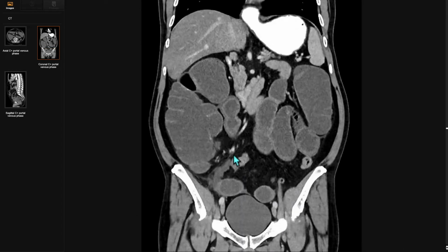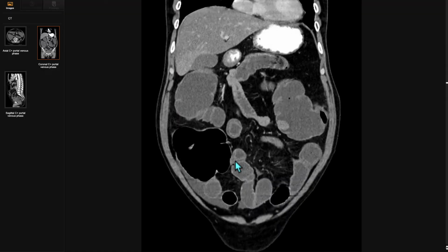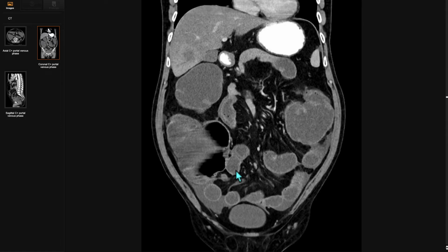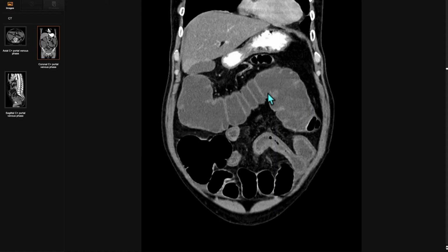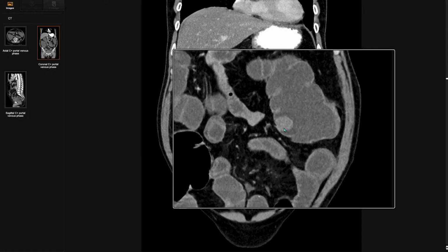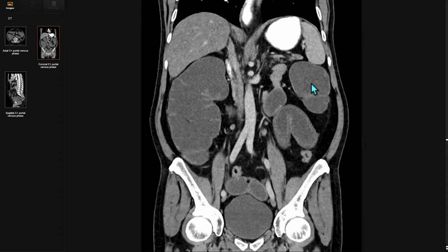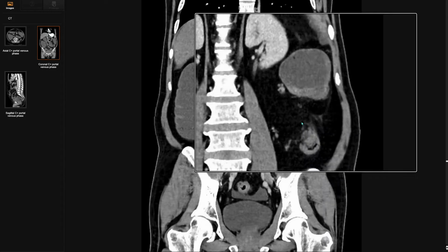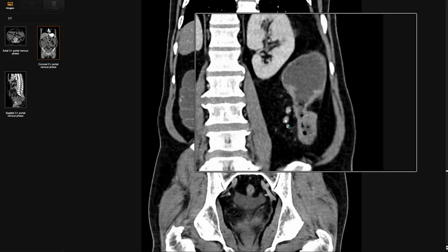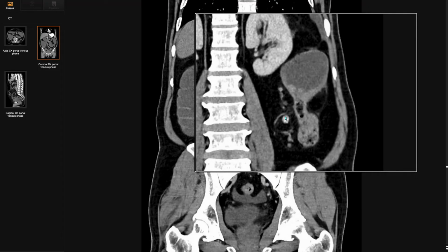And of course, don't forget a large bowel obstruction causing a small bowel obstruction secondarily as a result of reflux through the ileocecal valve. Here, if we follow the transverse colon across midline, we see a second finding of an intraluminal mass here that might be important and inform their surgical resection. And as we continue to scroll distally along the descending colon, we find mass-like shouldering and narrowing and multiple abnormal mesocolic lymph nodes. This is from colonic adenocarcinoma.